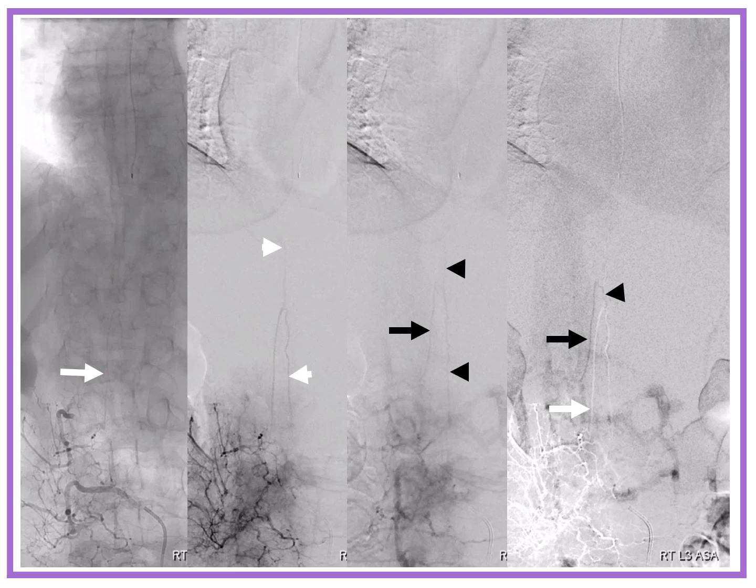Now, on the third image from the left, we see the black arrow and the black arrow heads pointing to the venous structures, which is the radicular vein, the black arrow, and the spinal vein, either anterior or posterior, with the black arrow heads, right? It's very important that in the venous phase, we see the veins. That tells us that there's no venous hypertension there, at least qualitatively. That's very important information.